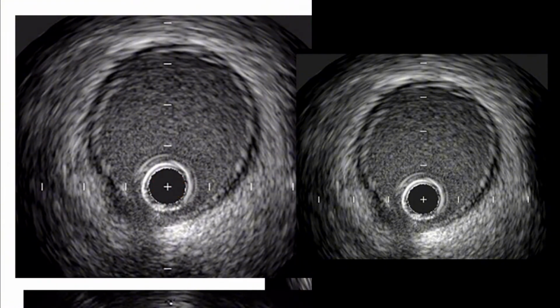Do you remember at least the normal order of vessel layers? The centermost being the lumen, and we had a cool acronym, LIMA: Lumen, Intima, Media, Adventitia. L-I-M-A. We look at color changes and different shading when it comes to IVUS and OCT.